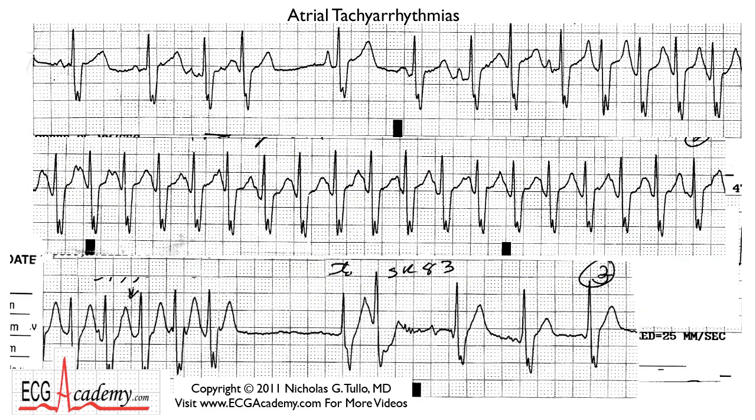This one might be a little bit easier to see, but it does have a slightly different flavor here because the QRS is wide. This patient has an underlying bundle branch block, and that makes the QRS duration somewhere about 120, 140 milliseconds. But clearly you can see P waves that precede these QRS complexes, and it looks like you have a normal sinus rhythm at a rate of about 70 beats per minute. You have an atrial premature beat here. You could see there's a P in front of it, but it looks kind of pointy compared with this P wave. So it probably came from a slightly different spot in the atrium.